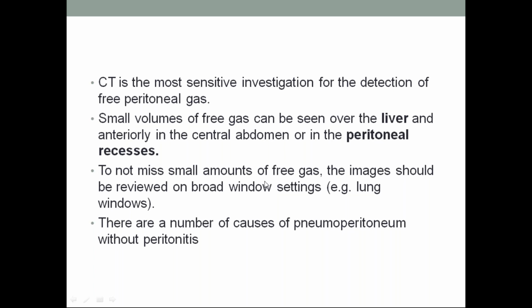So as not to miss a small amount of free gas, the images should be reviewed on broad window settings. Actually, these are CT things; you may not know what the broad window settings are. For example, lung windows and mediastinal windows. In CT some windows will be there. If you are aware of that, then you can understand.